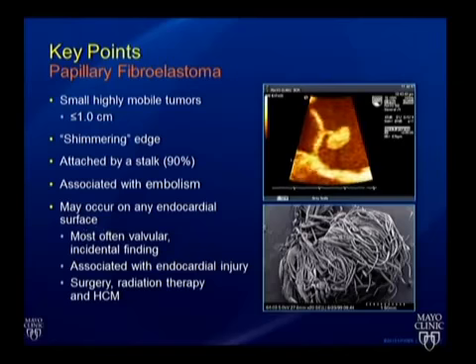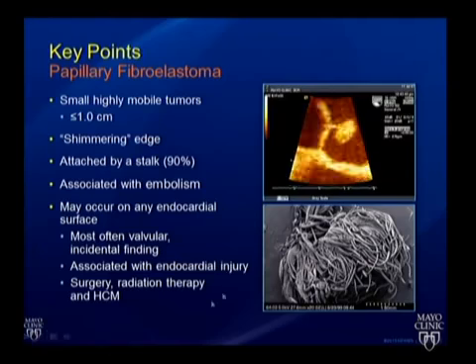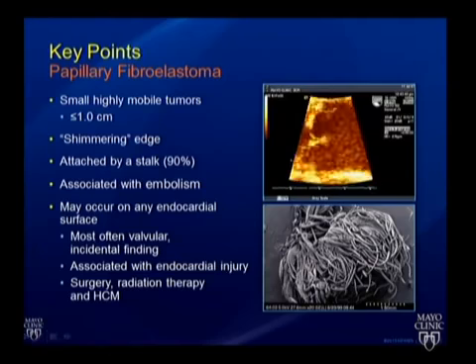These are the ones where everyone says, I don't really want to see that on the echo. I wasn't looking for that. But these are an opportunity to prevent a stroke in patients with these masses.